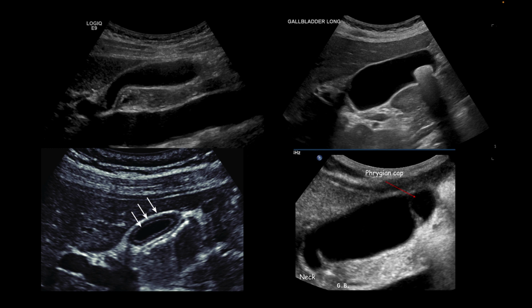The third picture there in the bottom left of screen shows a small contracted gallbladder, and this is the typical appearance of a postprandial gallbladder. So if someone's just had a meal, as is often the case in the emergency department, it can be very difficult to actually identify the gallbladder, but this is what it looks like. It's a small structure in the same position up against the right free edge of the liver usually, and it's often small and contracted, and the wall does look thick, but it's symmetrically round, and we get the clue that this is just a normal contracted gallbladder. We just ask the patient, when did you last eat?